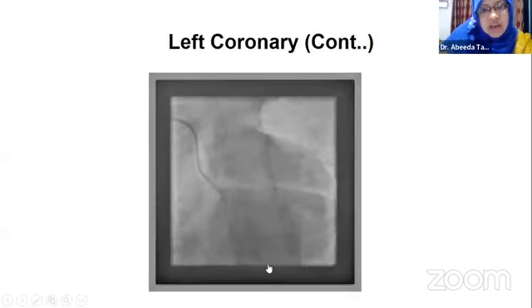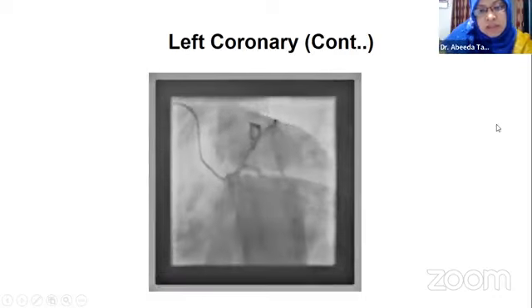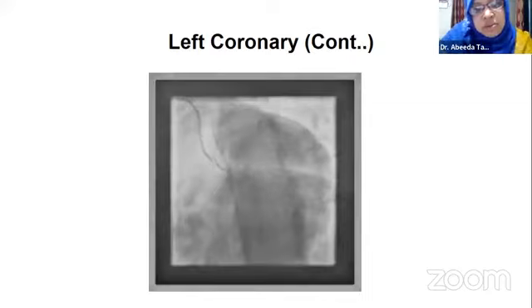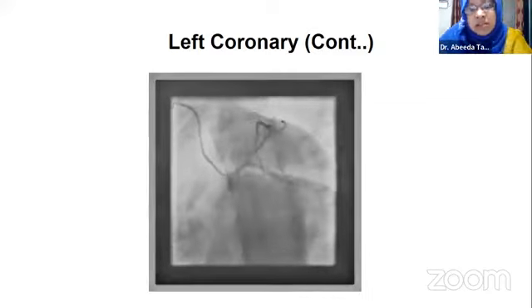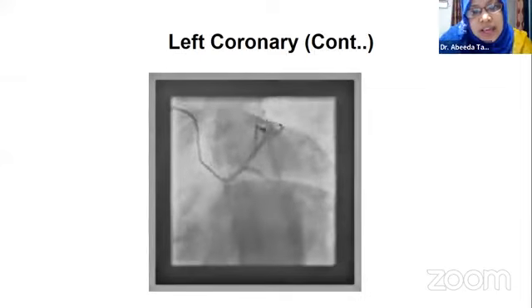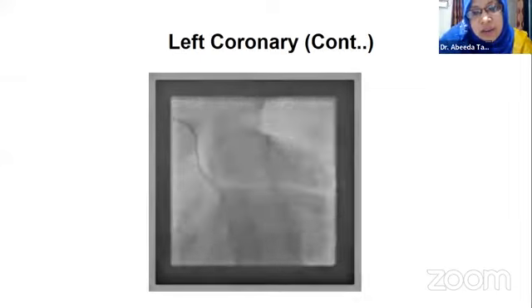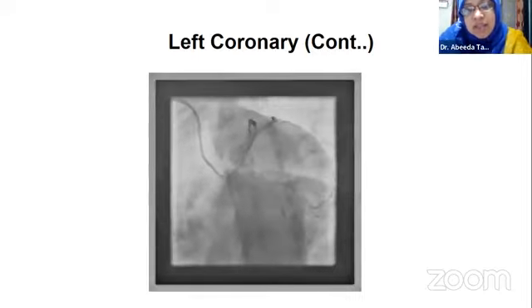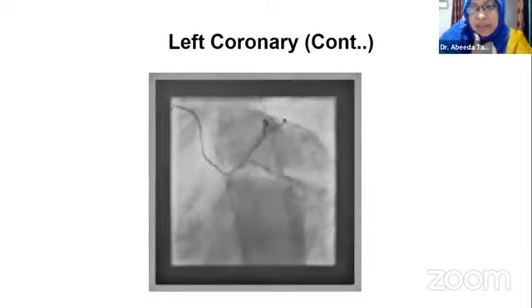So what we did is we kept the patient on medical management, conservatively. The reason I wanted to show you this ECG is that I have a question. What happened in this case? She did not get thrombolized. She had persistent ST elevation in 1 and AVL, but we did not find any lesions. So what happened in this lady?